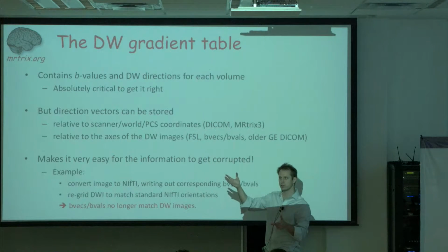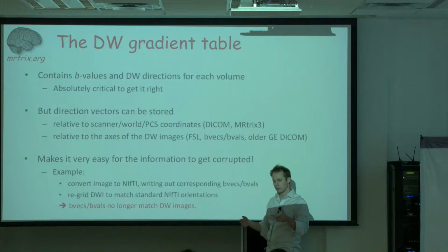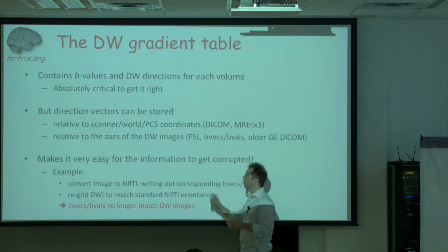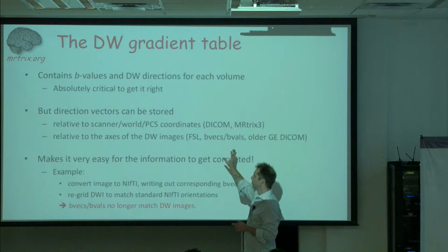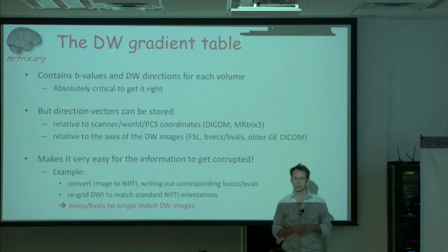If you tilt your axes, so it's an oblique acquisition, then your coordinate systems are different from the scanner, and you will get different interpretations of the vectors depending on which convention is actually the right one. That makes it spectacularly easy for things to go sideways.